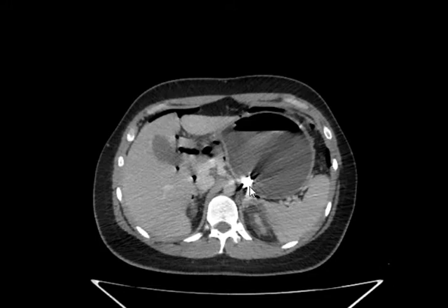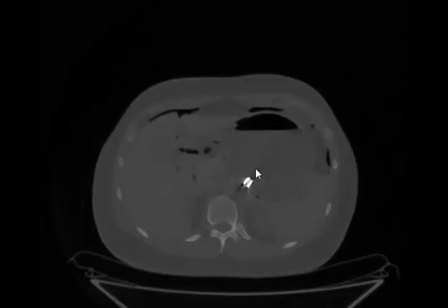The balloon has a valve. So the air within the balloon is normal, because they inflate the balloon with fluid and some gas gets in. But the air outside, which you caught, is a good catch, because no one would think of seeing the lung window, or even bone window.